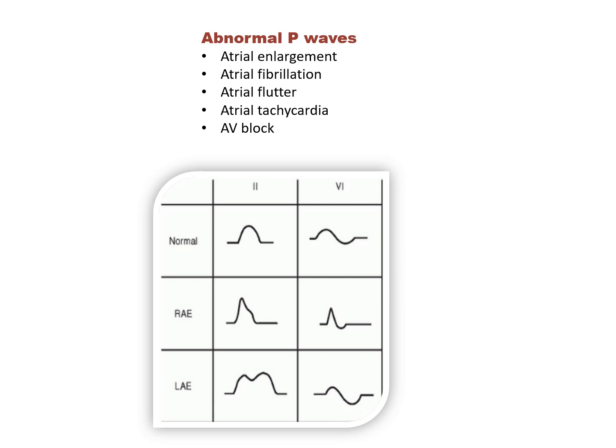Left atrial enlargement. The most striking sign of left atrial enlargement is a wide P wave greater than 0.12 second or three small squares with a predominance of the negative final component in lead V1.